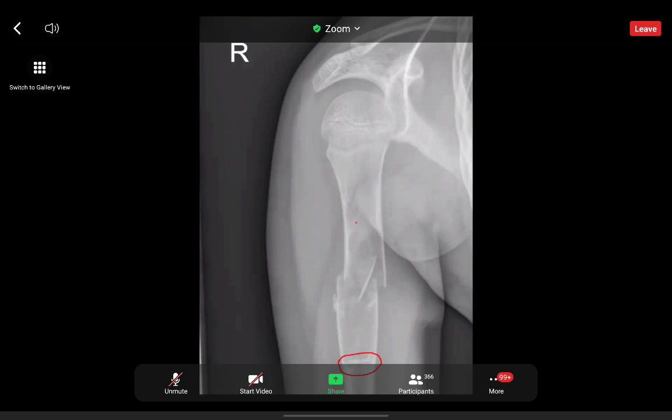I can see some people saying ABC, and some people saying Langerhans cell histiocytosis. Langerhans cell histiocytosis may look like this, but we've got a pathological fracture with the fallen fragment. So that's what would make me think we're more towards a unicameral bone cyst. And it's not a typical position of an aneurysmal bone cyst. That would usually be more metaphyseal. This is diaphyseal, which makes it more likely to be a unicameral bone cyst.